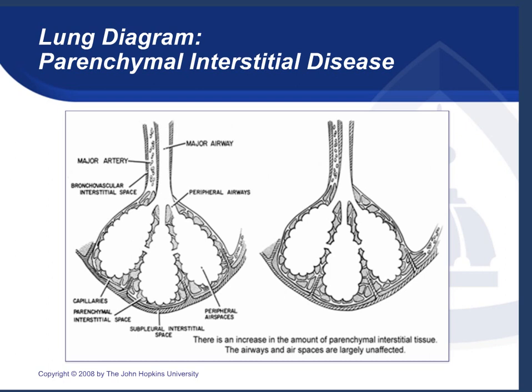As opposed to alveolar filling processes, we also have processes that fill in the interstitium, the parenchyma, problems that infiltrate the lung and not the air sacs themselves.